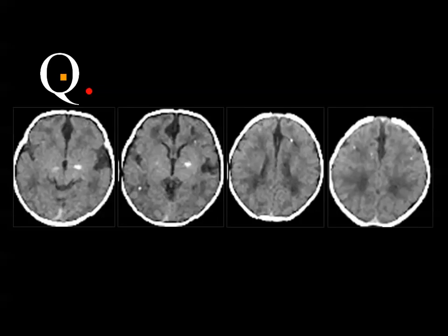The exam: axial CT scan of the brain without contrast injection. Findings: no available history. Multiple hyperdense foci scattered in both cerebral hemispheres. And do you think that this is blood? This is calcium. It's very dense for being a blood, and this is calcium.